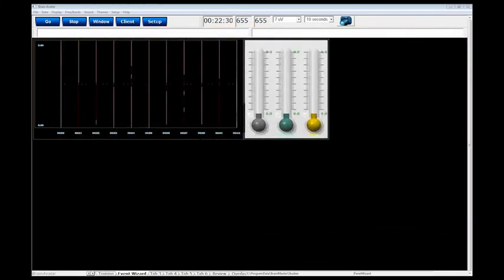And I can bring it over to my next menu. Okay. Yeah, I didn't realize that was a feature. Correct. Panel Wizard for the client screen is coming soon. We haven't had that many people go with it yet, so that's why we haven't put it on the front burner.